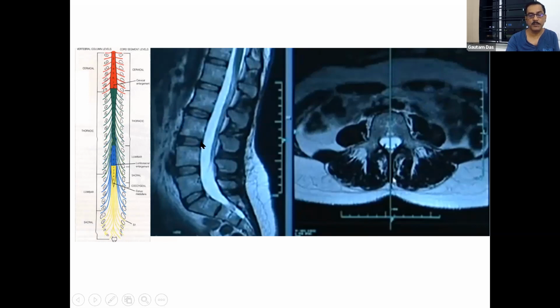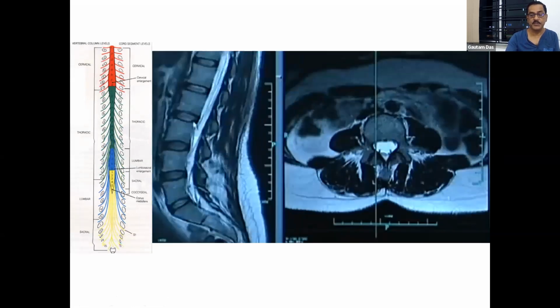You can see the vertebral end plate. We can see the annulus. This is annulus, this is annulus. You can see a very mild fissure in the disc. This is common in the 30s also. So this starts early in the 30s. This is a sign of degeneration, not degeneration, sorry, dehydration. This is the earliest sign.